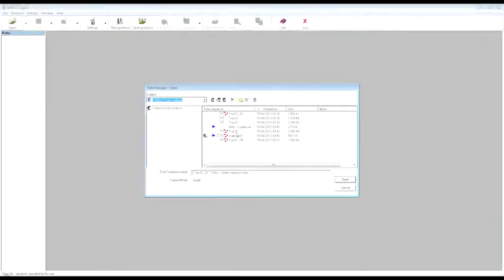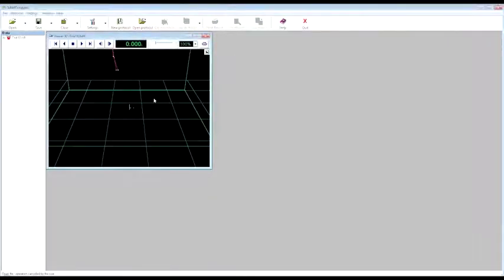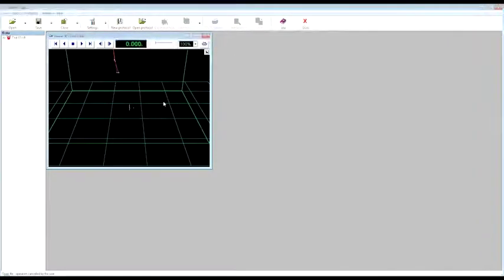And as you can see from here, now we can see that also another icon is on the side of the name of the trial. Before we have just the cross icon. Now we have also the icon related to the 3D markers. That means that the trial has been already tracked. Remember that you can load into the Smart Analyzer application just tracked file. So file that contains information about 3D trajectories.